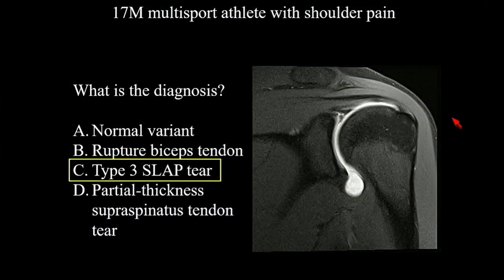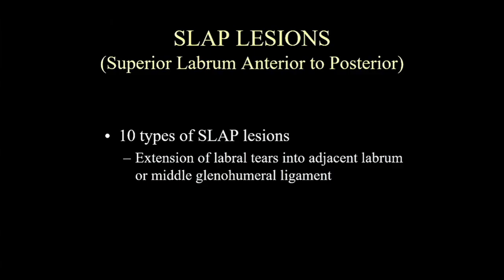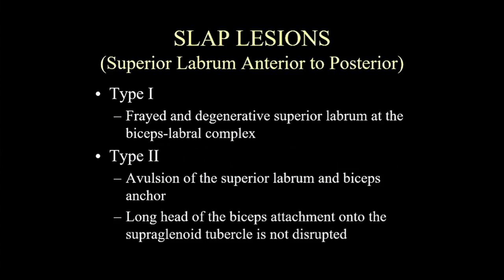Going through the superior labral tears, this is a representation from Netter images and Stoller, which are beautiful. What you're seeing is the displaced bucket handle component of this superior labral tear that's being inferiorly displaced into the joint. This is one of the many types of SLAP tears, and there's up to 10 or more which you don't need to know. You can reference them if you'd like, but in reality, it comes down to about 4 SLAP tears that are reasonable for people interfacing with the orthopedic surgeons to know.